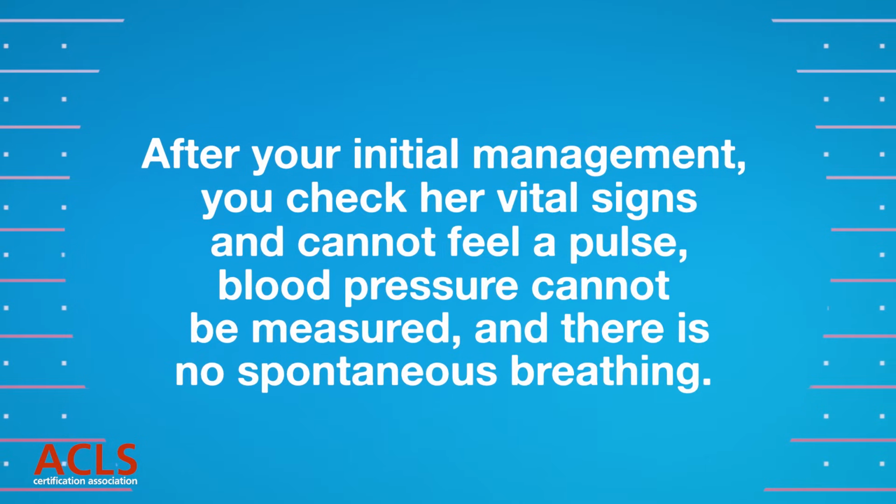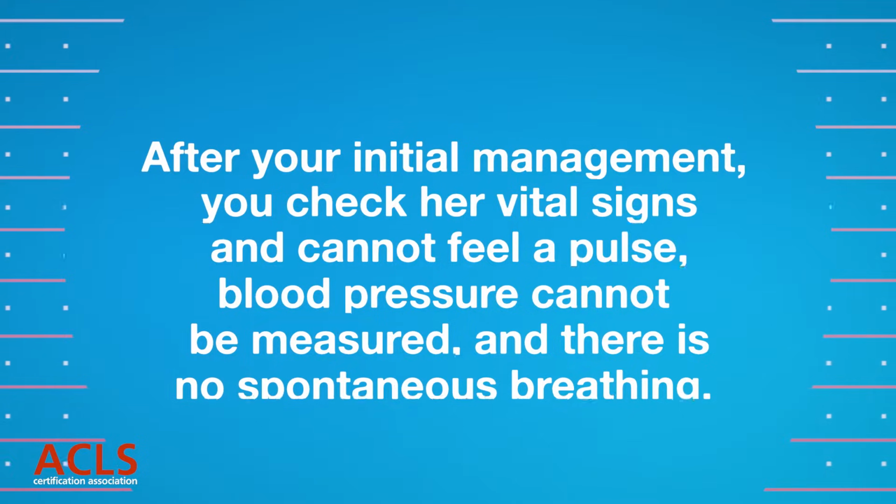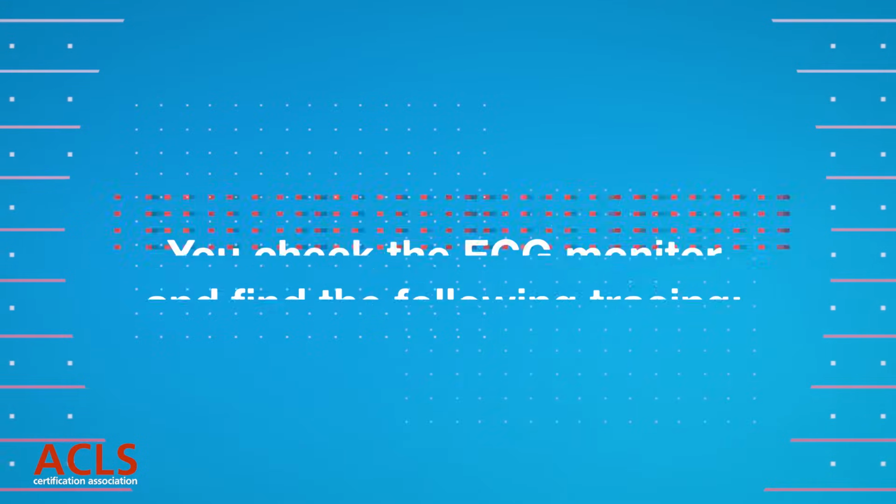After your initial management, you check her vital signs and cannot feel a pulse. Blood pressure cannot be measured, and there is no spontaneous breathing. You check the ECG monitor and find the following tracing.